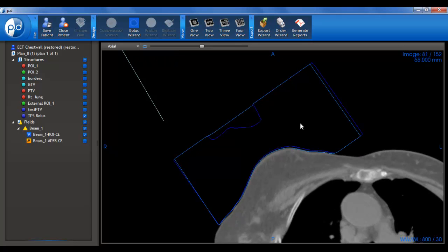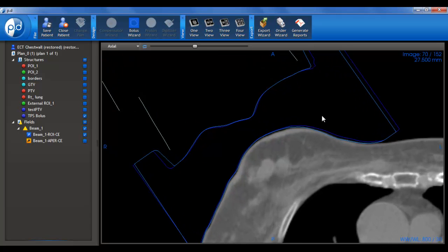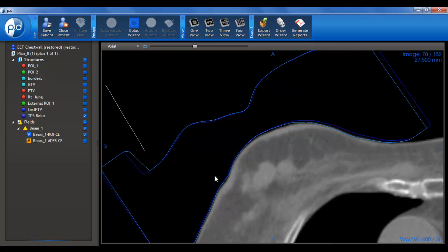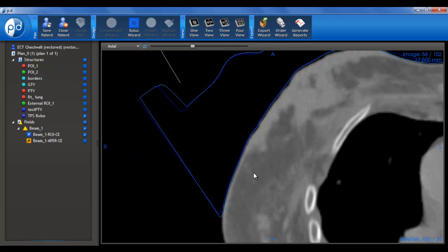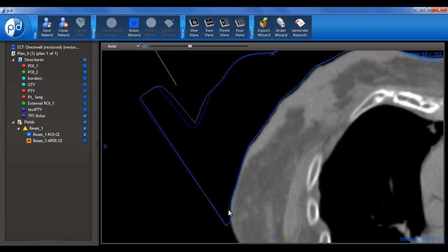So we can see that, well, for the most part, it does a pretty good job. We can see that in the very steep areas, it will pull away from the wall a little bit due to the rolling ball. And we can see that, well, the patient side surface will pull away a little bit in some cases as well. So as we get steeper and steeper, we see that it tends to pull away just a little bit. These kind of quick turns right here tend to be a little over-exaggerated by the rolling ball smoothing. So we need to keep that in mind if we're going to apply rolling ball smoothing to these parts. Okay?